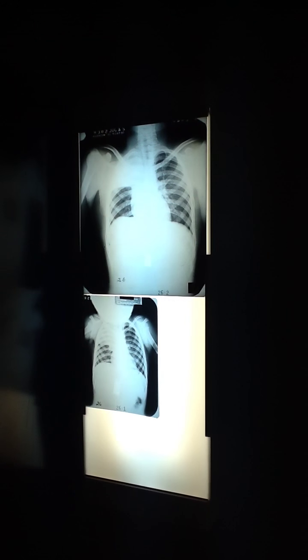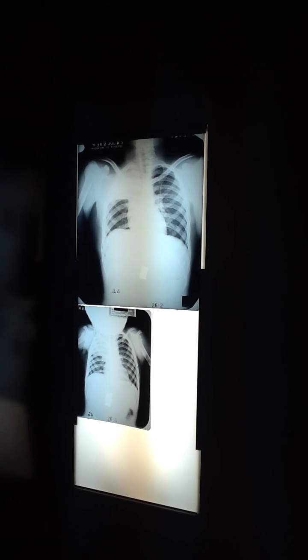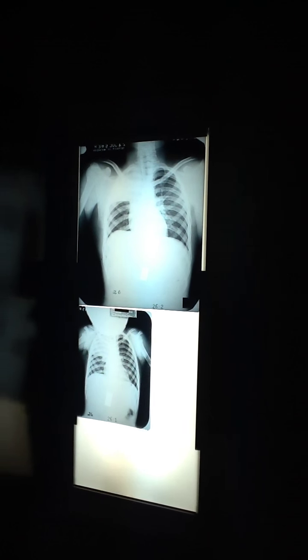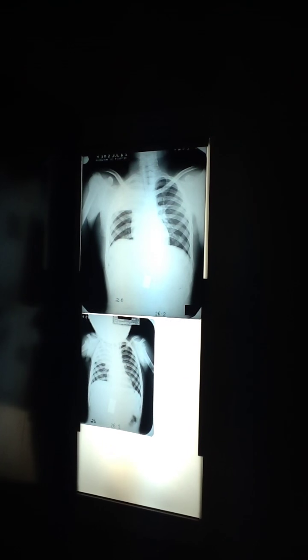All right, so let's pay attention to how the density changed, because when the lung is abnormal, the density changes. Normal lung is radiolucent. If we look here, it's radiolucent. It's radiolucent because the lung is a big sponge.